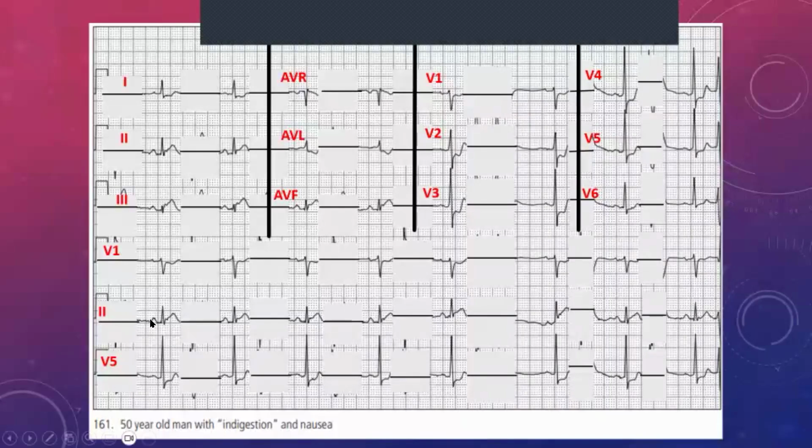So the first thing that we can look at is our P waves, which we see here. And we see our P waves are generally the same, and they're generally quite regular, all right? Our QRS complexes, just in this case, we're not talking about the rest of it, we can see that they are narrow. These particular ones are narrow.